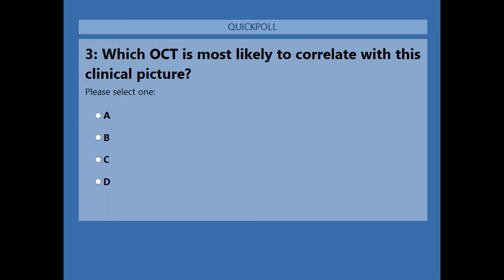Well, what if they have a choroidal neovascular membrane that should not be there, but it's not leaking fluid yet? The OCT may not detect that intraretinal or subretinal fluid. So to me, the beauty of OCTA is to image it one step sooner, before it leaks fluid into the subretinal space or other spaces. Now we can image the choroidal neovascular membrane directly, which is hard to do with OCT. Not impossible, but hard to do with OCT. Certainly fluorescein has done that traditionally, but OCT angiography, the ability to image it one step sooner in macular degeneration.